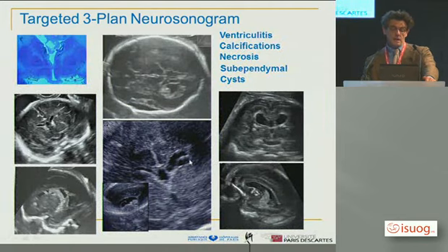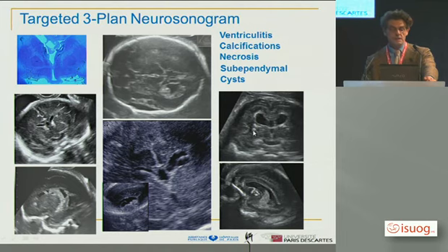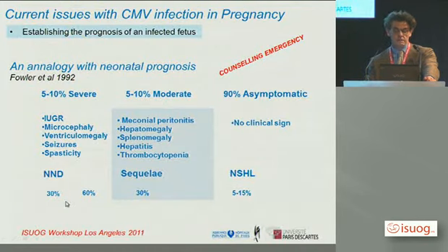Those cysts are sometimes very subtle, and you have to look for them. The periventricular hyperechogenicities are characteristic. They are the initial aspect of periventricular leukomalacia that is going to become cavitations very soon and potentially porencephaly. Calcifications disseminated in the white matter are very frequent, and necrosis of the ventricular rim and the choroid plexus is also very evocative.